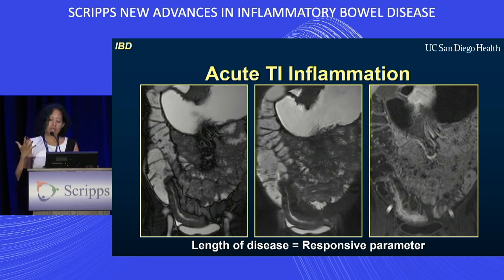And I don't normally get too into the weeds as to making sure it's a curved planar reformat and making sure it's precise to within 1 millimeter. But within 5 centimeters or so is usually what we're aiming for, and we usually see that degree of change from one exam to the next often.